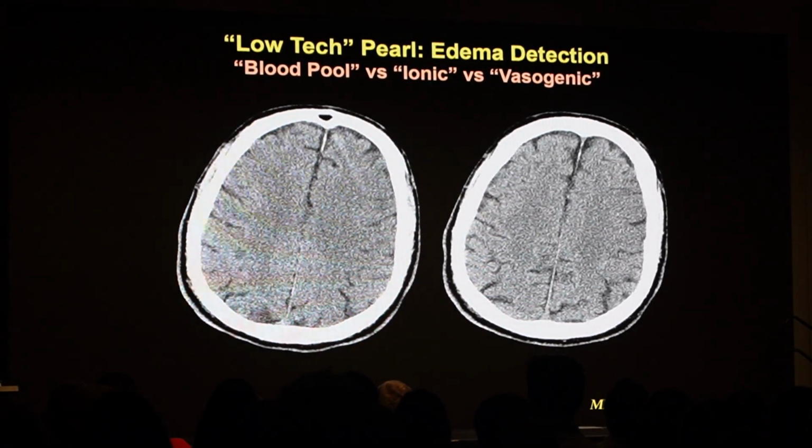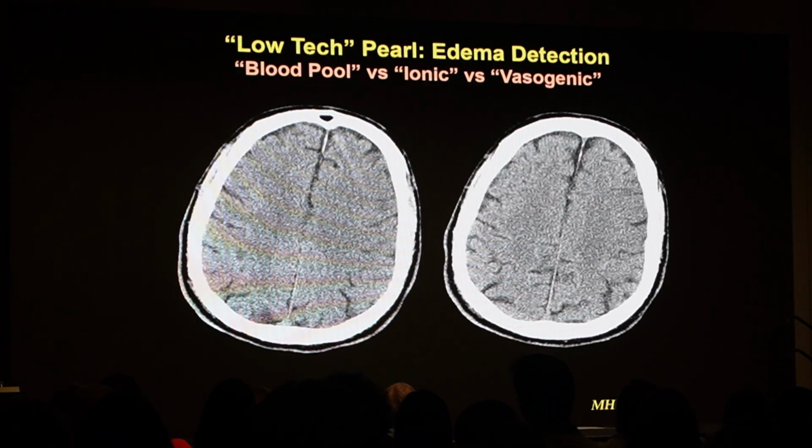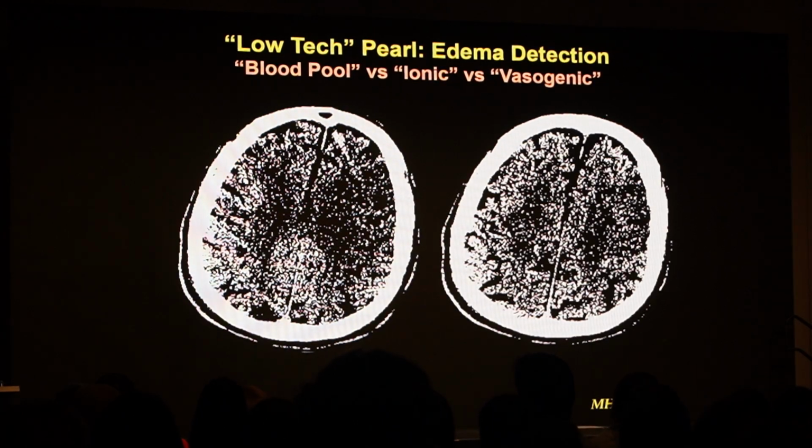I've been thinking about non-contrast head CT for over 20 years, and basically there is a stroke here. There is subtle low attenuation, and if you look at the gray-white differentiation, you can see which side it's worse on, but it becomes a lot easier to see if you use those very narrow windows. That's why I spent time in the first talk explaining that those are Hounsfield units, what they mean, and how to use them.